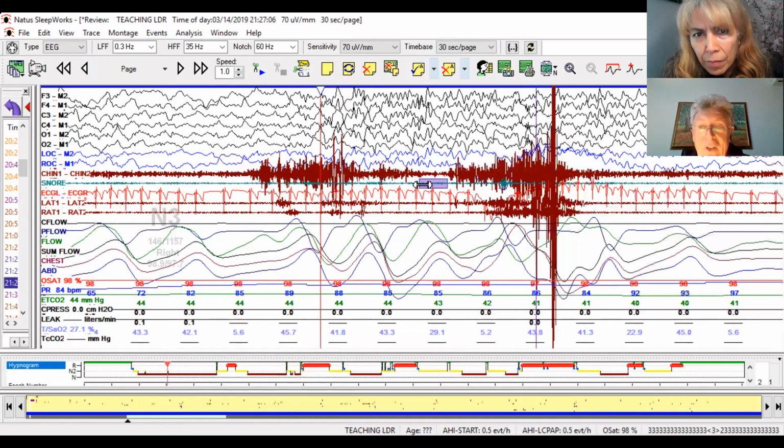So here is, yeah, barely 1 second. No, but you have to go, remember the rule, 10 seconds before the movement. So this is 30 seconds. Yeah. But if you go and see the amplitude of the EMG before the start of the movement on the left, oh, because it goes back to baseline, right?